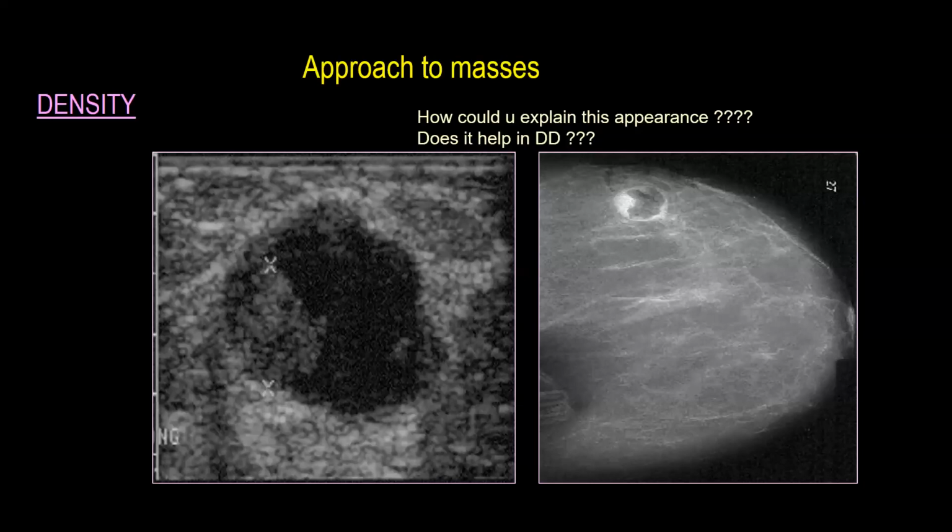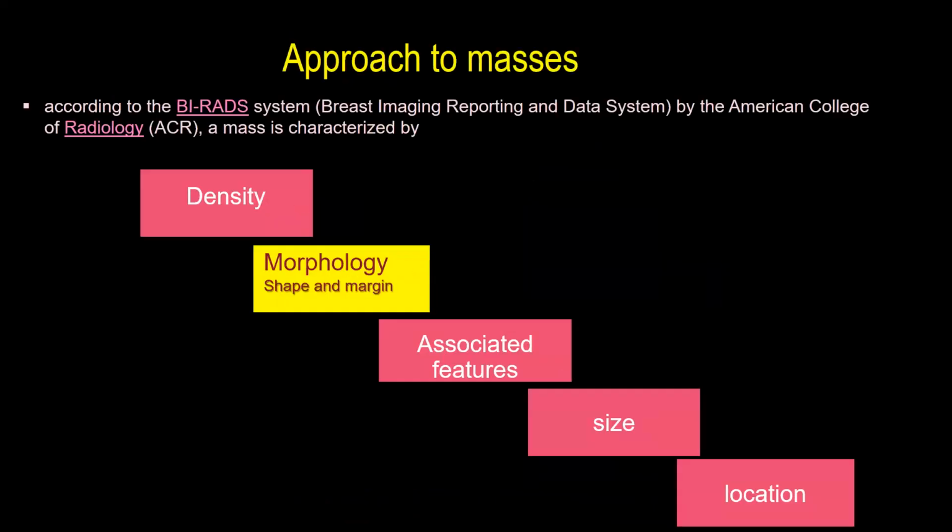But even one opaque lesion on mammography can be isoechoic, hypoechoic, hyperechoic, or mixed on ultrasound. So from here, it is obviously a cancer. It was an intracystic papillary carcinoma. You see, it appeared as a mixed density after interventions.